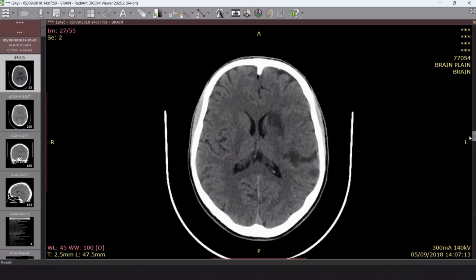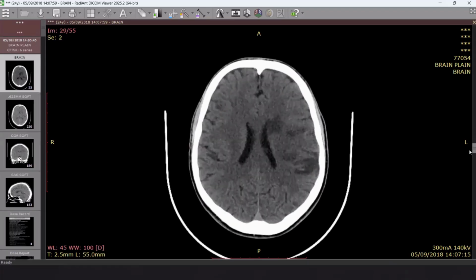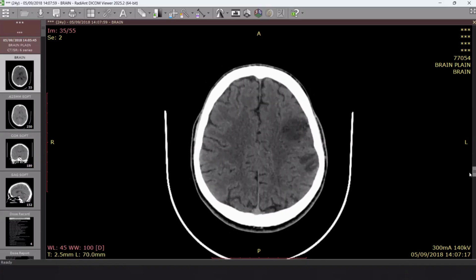I think, if this patient with CT... Do you mean with this scan specifically, in this CT brain? In this you are thinking that we have acute infarction along the territory of the left middle cerebral artery. Left middle cerebral artery. Yes, it's logical.